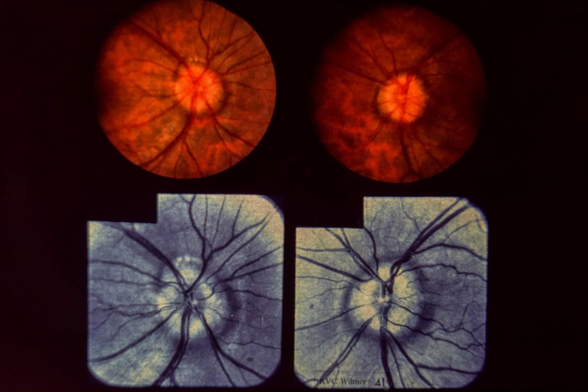Red-free photographs clearly show that the retinal vessels cross the surface of the disc without being obscured by disc tissue. No hemorrhages or exudates are present. If elevation of the optic disc were in fact caused by true edema, one would expect the retinal vessels to be obscured by overlying edematous nerve tissue. Instead, the vessels are clearly visible as they cross the disc surface, suggesting that the discs are elevated by some other mechanism, probably buried drusen. Even if one cannot see definite drusen, this ophthalmoscopic picture should not be confused with optic disc edema.